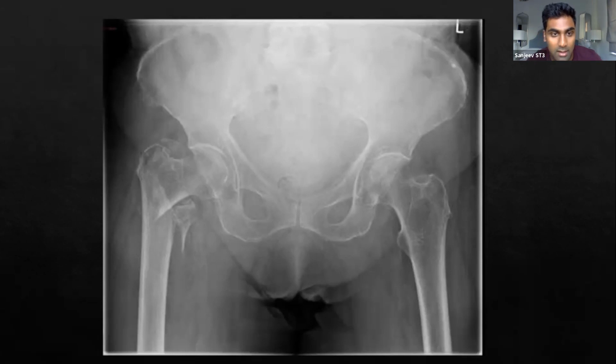The only other thing I'd describe for this one is I would also say this is minimally displaced or slightly displaced. And you see that there's multiple parts to this. So there's the proximal femur, the distal femur, and then this bit, which is the lesser trochanter. So you can say a multi-part intertrochanteric fracture with some displacement or shortening, probably the phrase I'd use in this one. So that's my last case, guys.